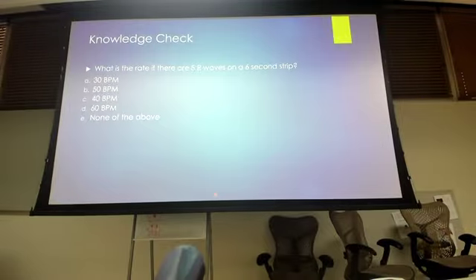All right. All right, we're almost done, folks. Sylvester Das, where are you? Are you there? Yeah. Right there. Oh, you sir. Okay. Rate.